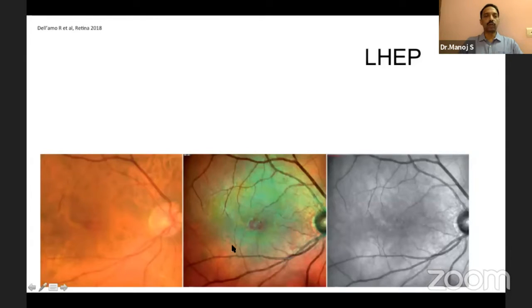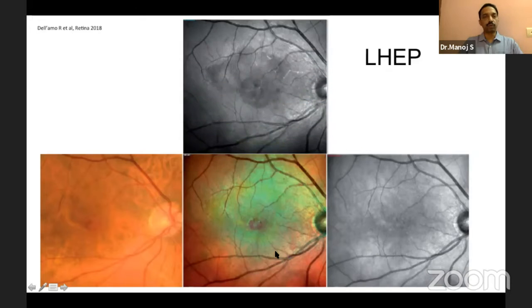One should also know that this is not seen on clinical fundus photographs very clearly. One needs to resort to multicolor imaging, especially the blue reflectance. The blue reflectance picks up these proliferations very clearly.